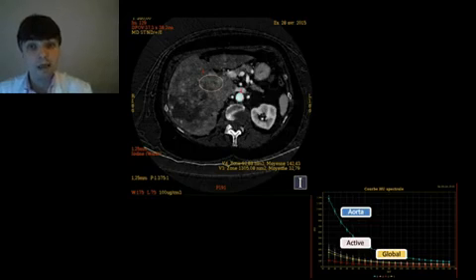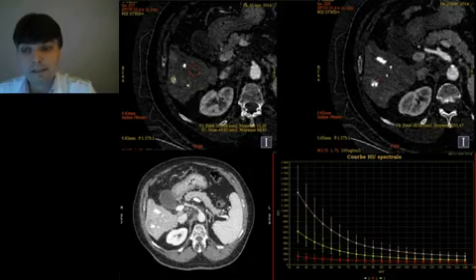And of course not, because there's tumor necrosis within that tumor. And probably we have here a hint where we could use spectral imaging to provide a functional analysis of the components of the tumor. And of course the liver behaves also differently because it shows less enhancement on the arterial phase.